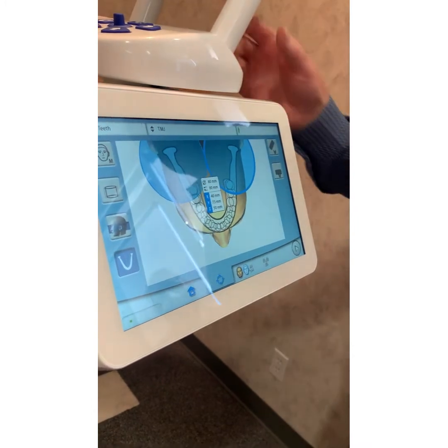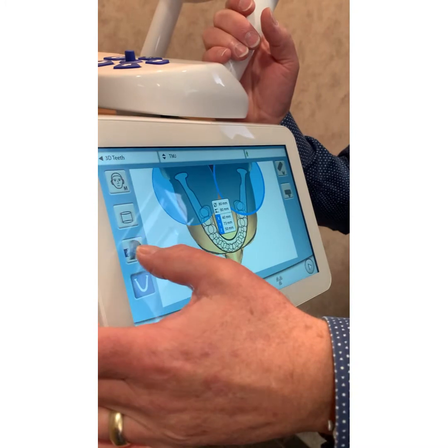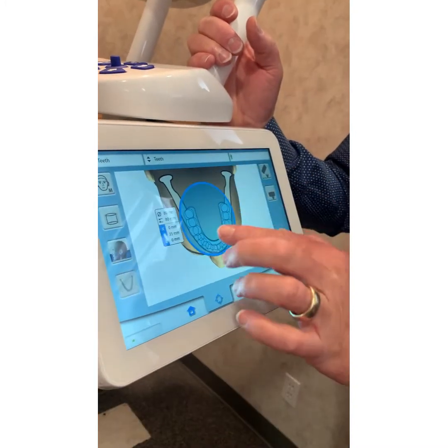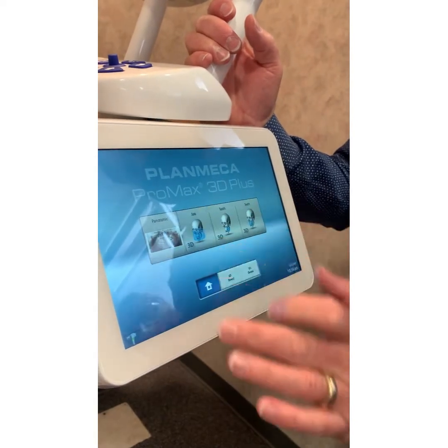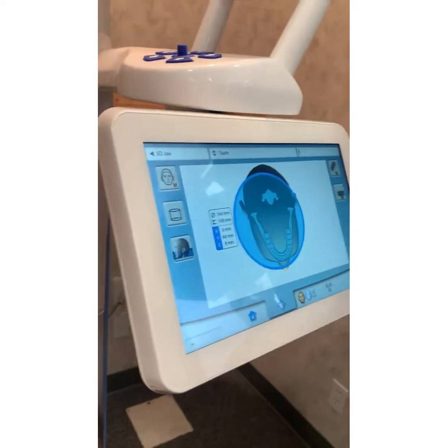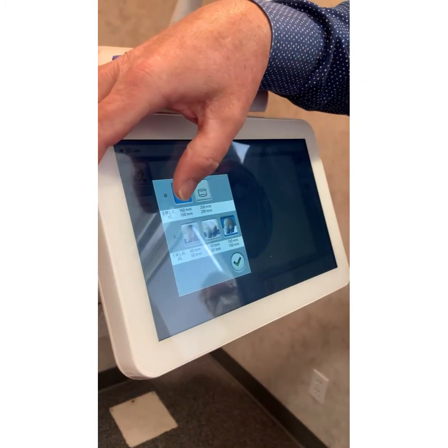Oh, that's interesting. So you're really not going to use that, because you are going to get it all in 10 by 10. Well, not the cutout, actually. Watch this. This is jaw. Now I'm getting 10 by 20. And what would be the purpose of that? You're getting both condyles in the same shot.